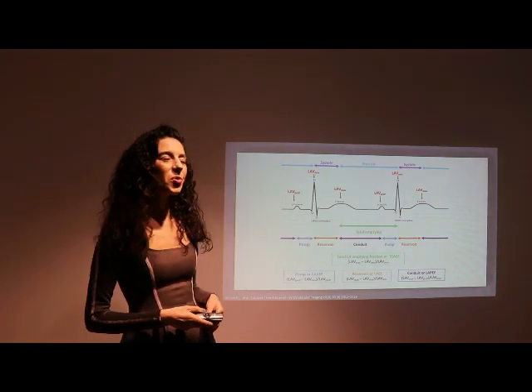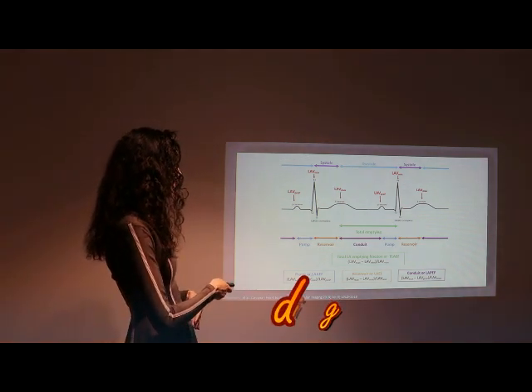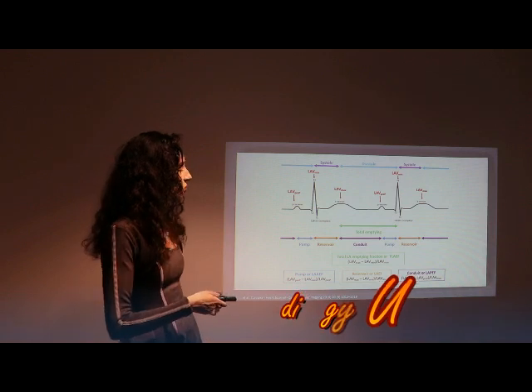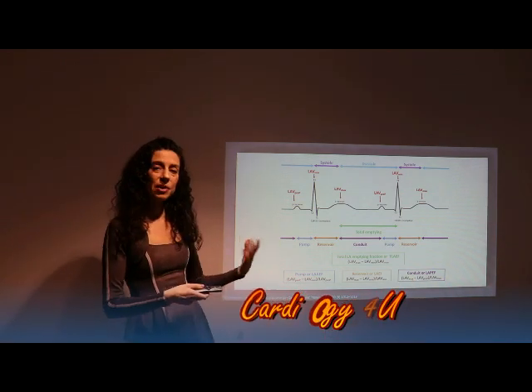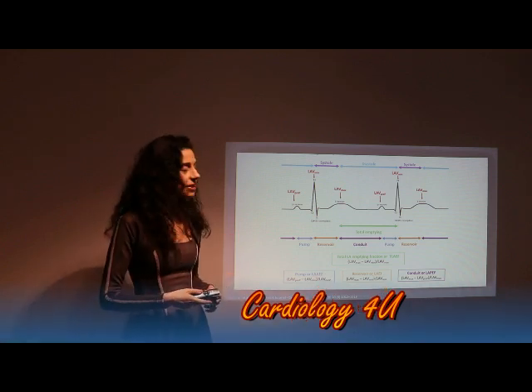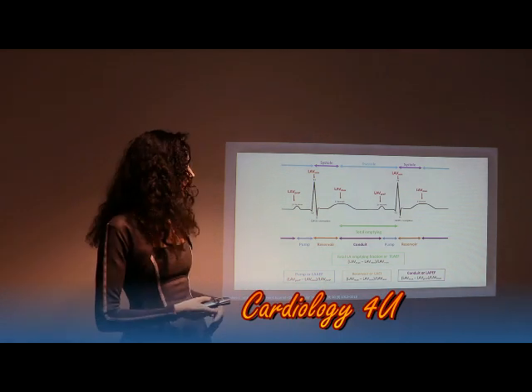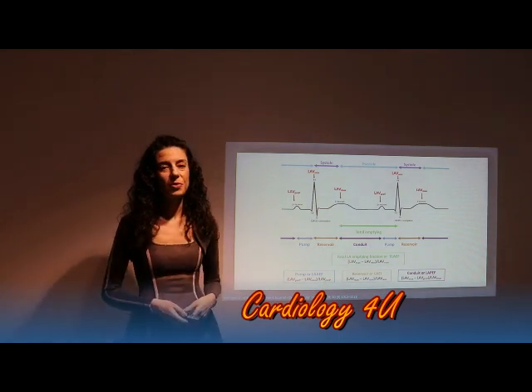And the other very useful functional parameter is the pump function, or the active left atrial emptying volume, which is measured as the difference between the left atrial volume just before the P wave or the A wave, or from the mitral inflow, so the pre-P left atrial volume minus the minimal left atrial volume, divided by the pre-P left atrial volume.